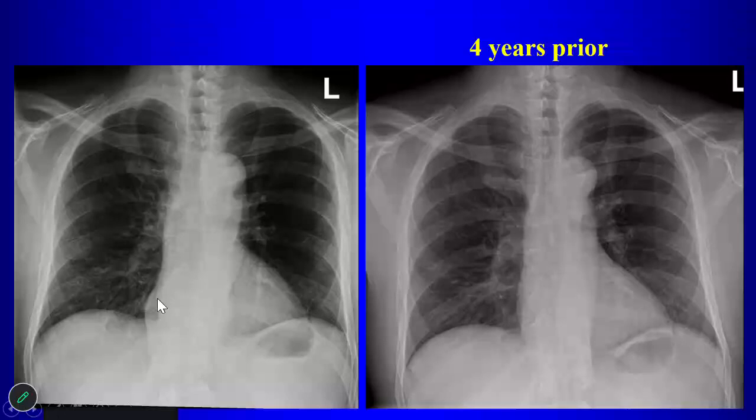What am I pointing to? Oh, look at the old film. What am I pointing to? That's the right heart border.